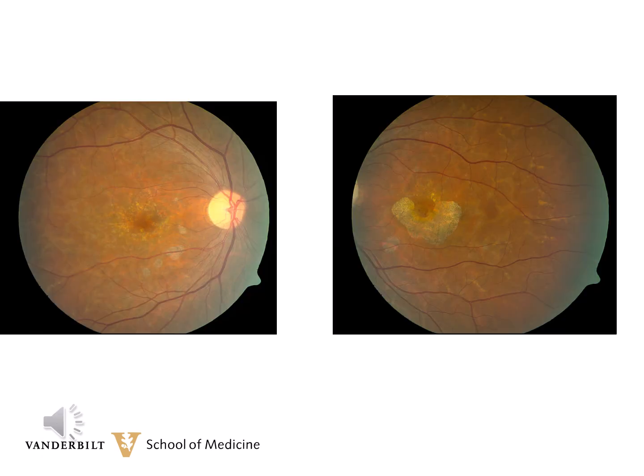Now, this example here is a patient of Dr. Anita Agarwal, whom she saw while at Vanderbilt, and was also published in the Gass Atlas. This patient is a 47-year-old African-American female with vision of 20/20 in the right eye and 20/50 in the left eye. She not only has type 4 pattern simulating Stargardt's, but she also has central areolar sclerosis.